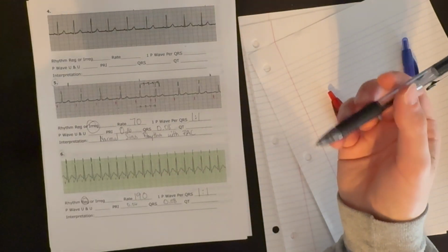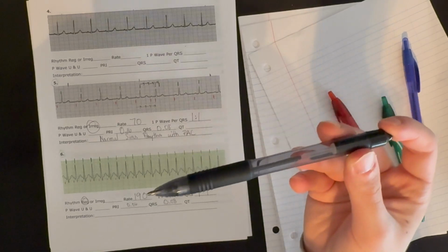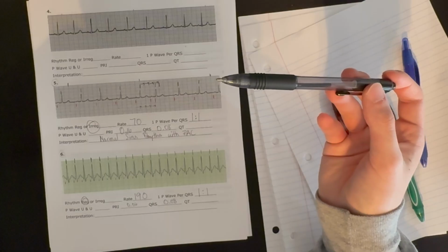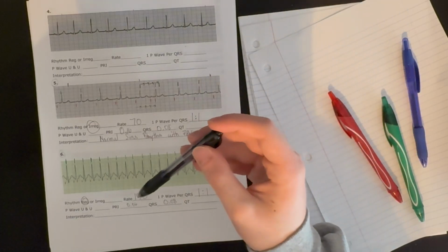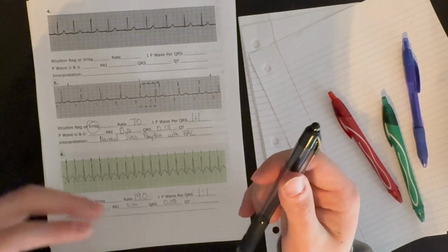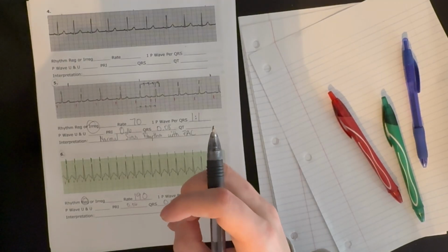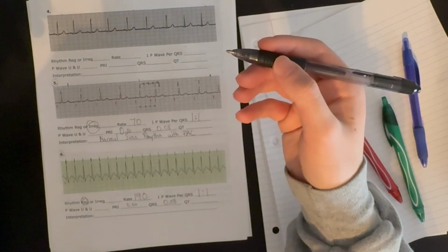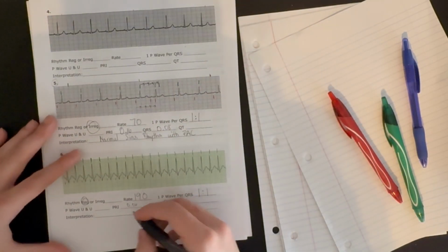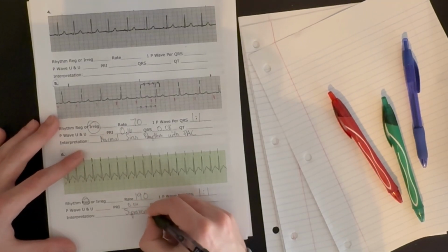So what do we have here? We have tachycardia that is originating somewhere in the atria above the ventricles. And we have a heart rate that is above 190. So tachycardia that has P waves, but they're barely present, and it's a tachycardia that's above 150 beats per minute, is a type of SVT, or supraventricular tachycardia.